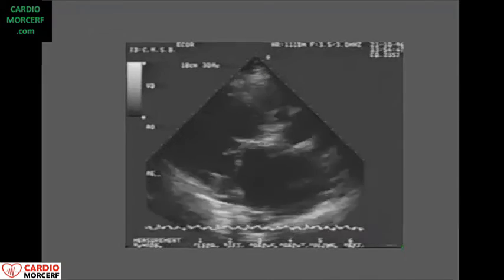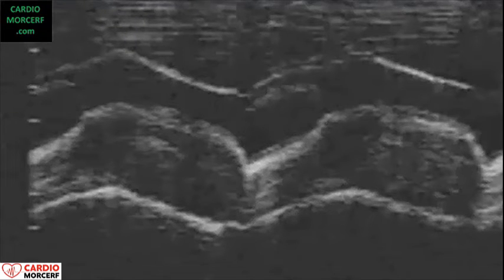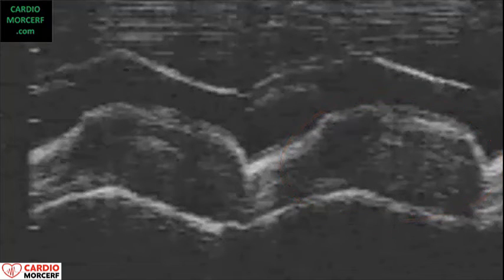Now pay attention to the aortic valve. Is there any doubt that it's heavily calcified? Now, the M mode of the valve. Is it calcified? Absolutely not. That is a huge vegetation. 2D echo cannot differentiate it. For M mode, it is very easy. See the smudge aspect. No characteristic lines with clear borders as seen in calcifications.